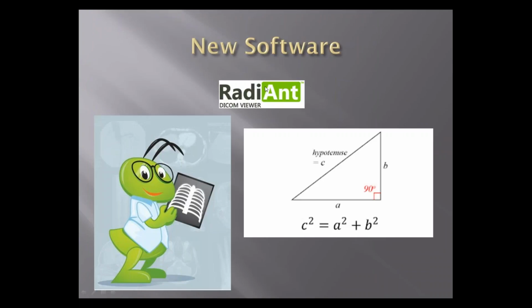Write this down or copy this or screenshot it or do whatever you got to do to remember this piece. This software called Radiant is a free kind of software you can just download off the web to read any kind of what's called a DICOM. You see it's DICOM, D-I-C-O-M, DICOM viewer.